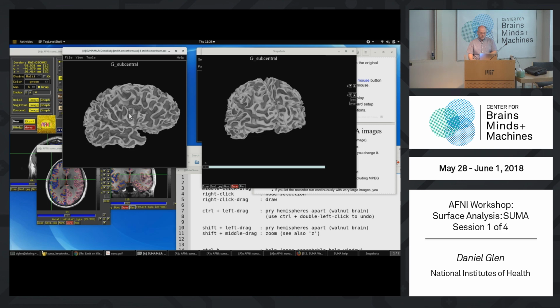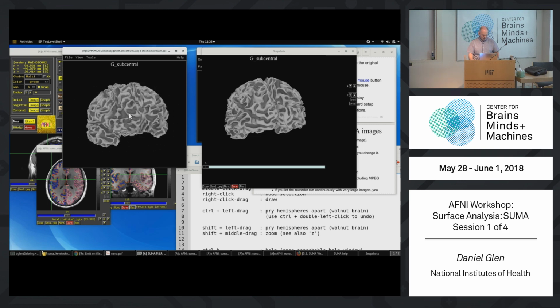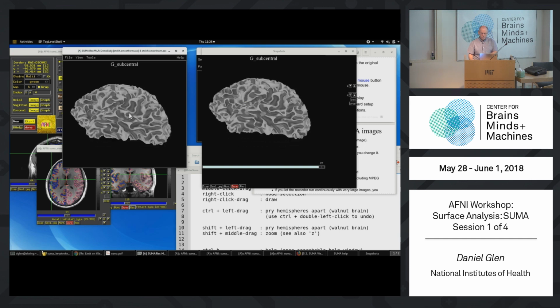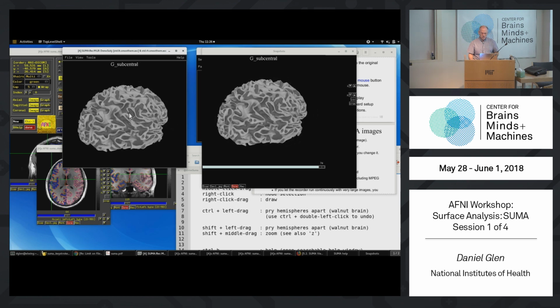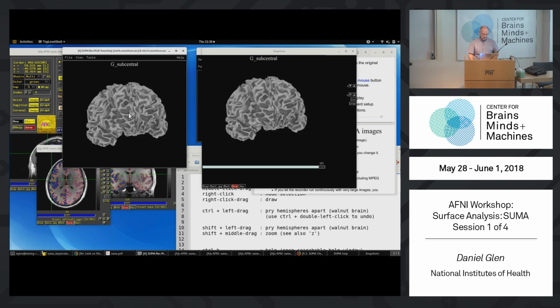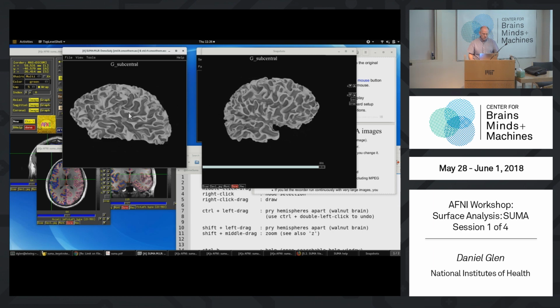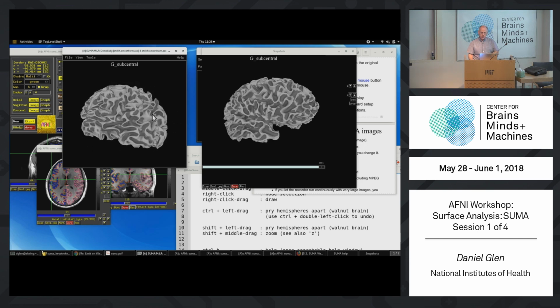and then right arrow. Oh, I'm sorry. Yeah, I didn't turn on the recording for keep recording. So if I want to keep recording, I have to do capital R. So up R over the SUMA window. And now I'll do that again. Right arrow. Okay. And then I'll do uppercase R. Again, the momentum is still going, but the recording has stopped.